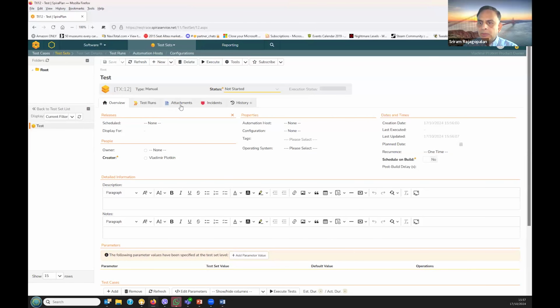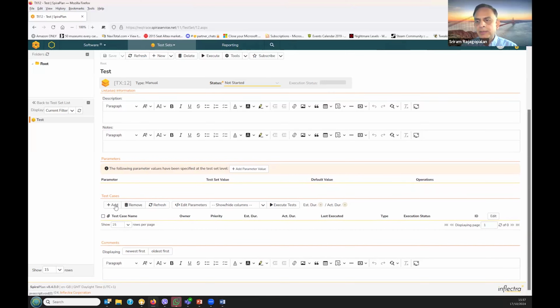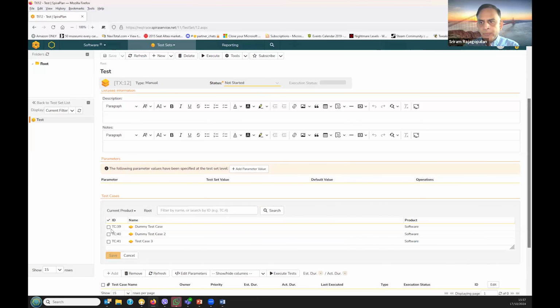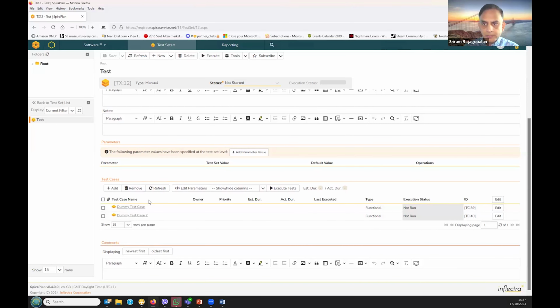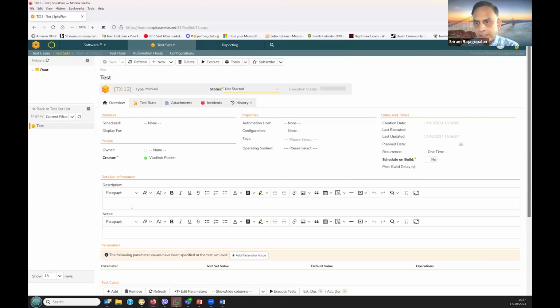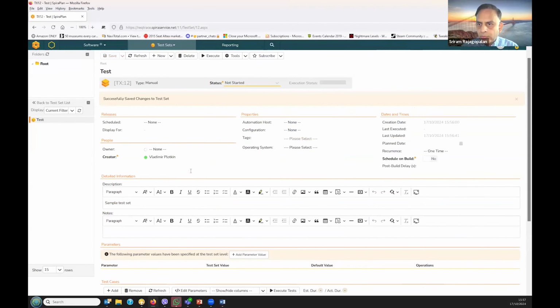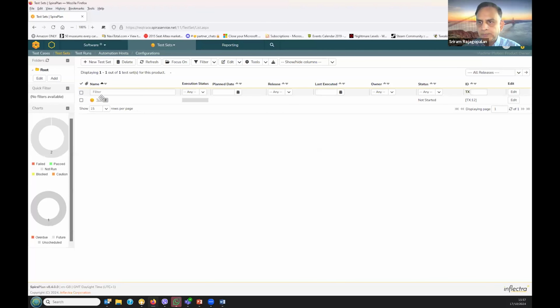Now you would be able to say, well, now that I have verified these things, I would like to have either new or existing test cases verifying this in a different environment, like QA to production, or pre-production and staging, or some specific scenario that you would like to test for that particular environment alone, like penetration testing, security testing, and stuff like that. So it is very flexible in that you can either use the test cases model, or you can augment that with test sets in addition. There is a lot of flexibility in terms of how you can support the V model.